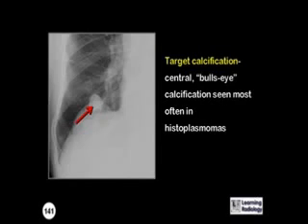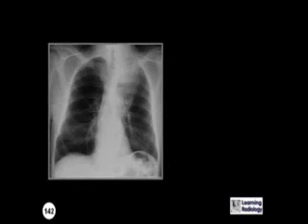This is a target calcification, a central or bullseye calcification seen most often in histoplasmomas. What sign is depicted here?